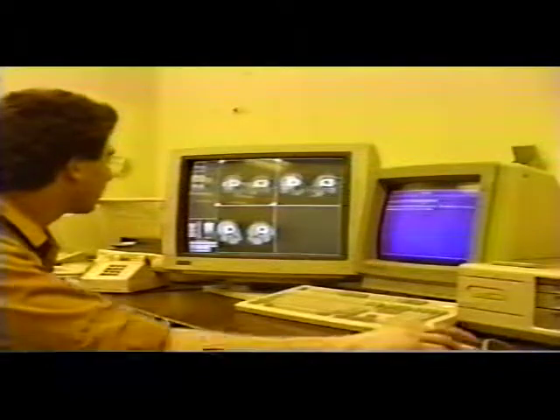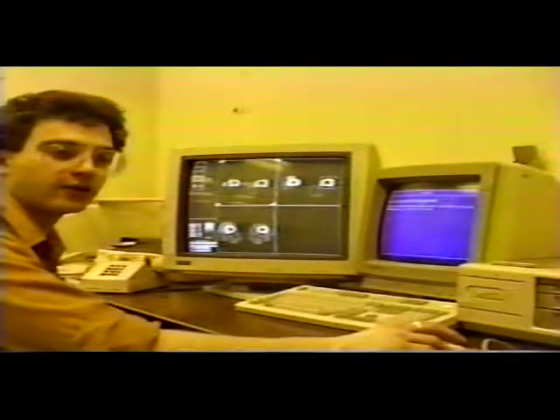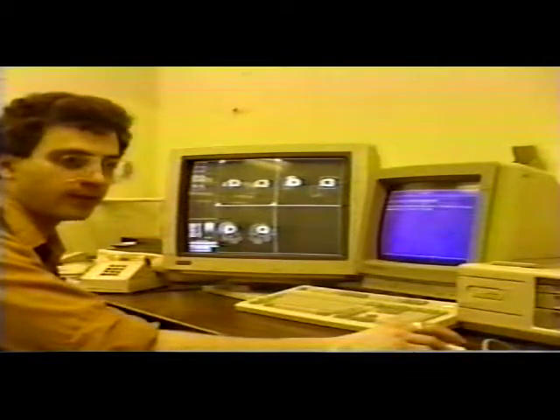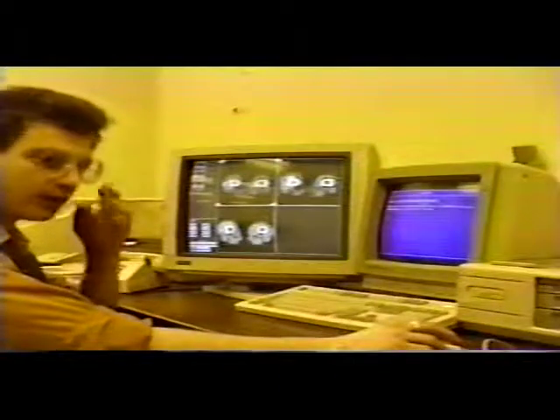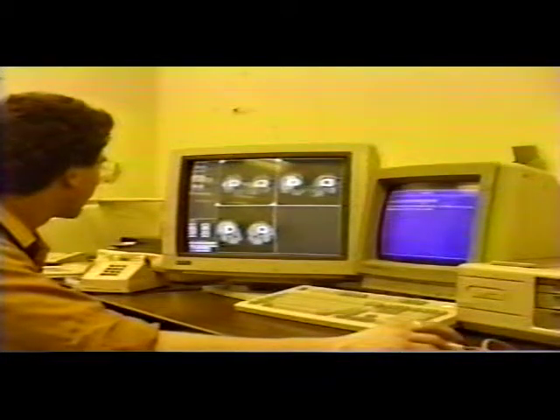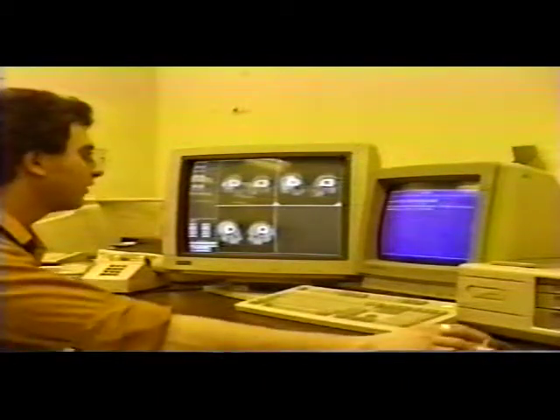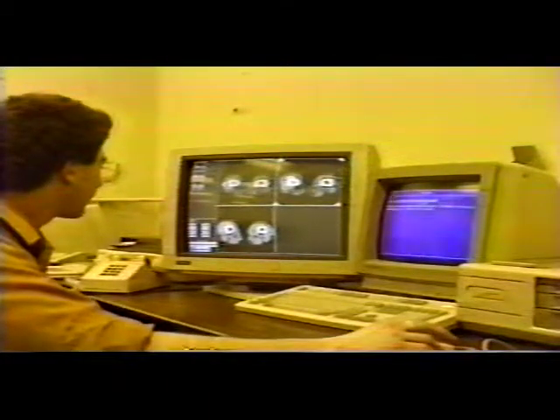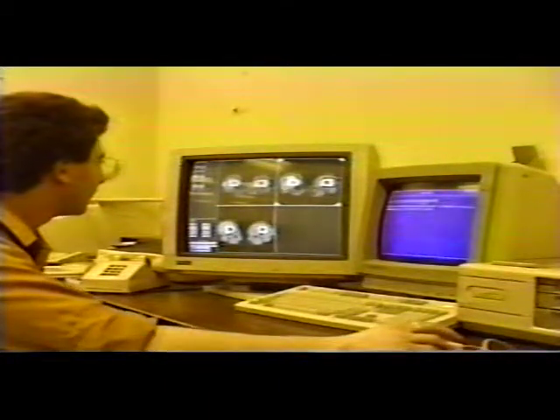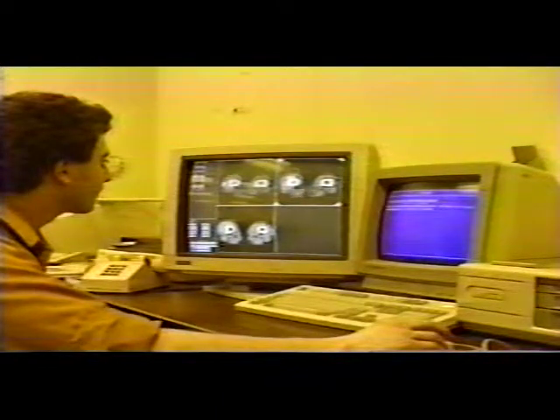I can click on the contrast control and change the contrast. And these are 2 sliders. One controls D-min and the other controls D-max. I can reset that. On the ROI radio button, I can then say, in this image, erase the regions of interest that are annotated. Draw them. I can even say, let me draw some new ones. Let me put a circle here. And let me put another rectangle there.